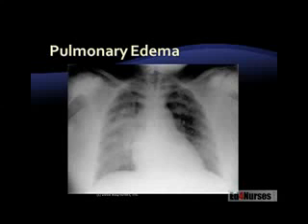Look how big the heart is, too. Okay, that's another cue that something's going on here. Heart failure, and the patient's got pulmonary edema. Big heart. You see how big that heart is compared to that heart that we saw in the first slide? So we're looking at the mediastinum. This patient here has pulmonary edema.